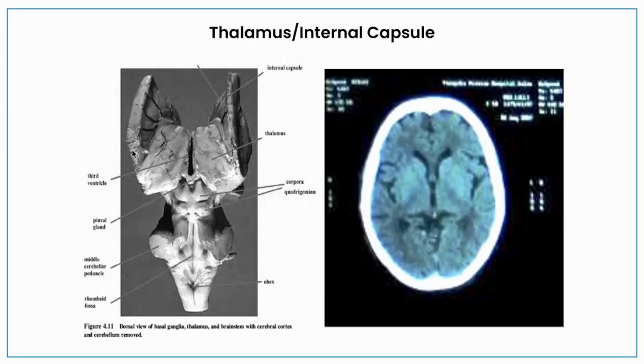Okay. So what is further away from thalamus? There are two wing shaped structures. These are your internal capsule. Where do they appear? Pay close attention here. Can you see this image here? The particular area where I am scrolling my mouse, this is your wing shaped structure right next to the thalamus, and that's your internal capsule. So this particular image of a CT scan actually shows your third ventricle, your thalamus right next to it, and then you have an internal capsule slightly further out. Quite easy to identify these structures, isn't it?